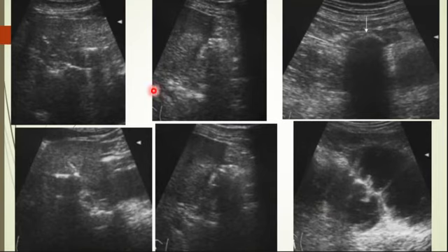Another example, you can see the biliary tree within the liver are all filled with air. The patient didn't have an ERCP. What happened? If you look carefully down, there is some small bowel obstruction. If you look more carefully, you can see a large gallbladder stone obstructing the small bowel, leading to gallstone ileus. Okay, and the air entered the gallbladder and the biliary tree through this perforation.